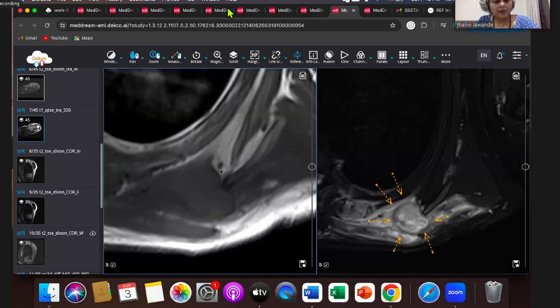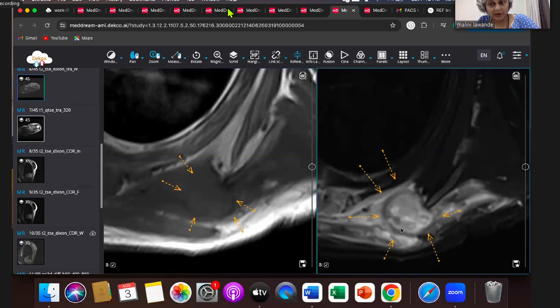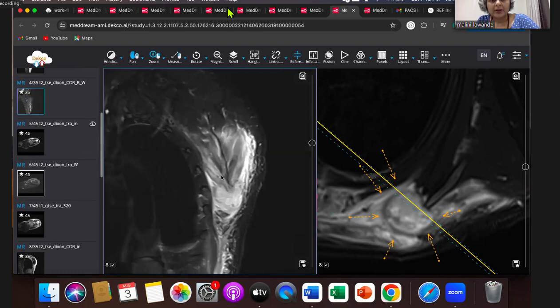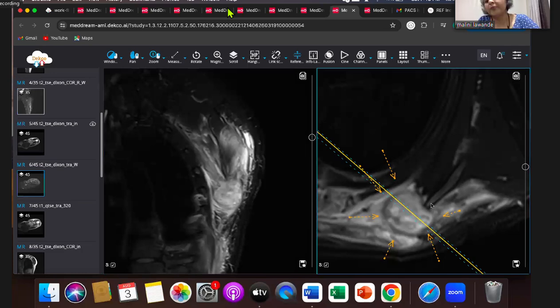Okay. Now, on this image, if you will appreciate, the rim is not hyper. Can you see a hypo rim? And the center is not very dark. The periphery is hyper. On T2, you can see the periphery better, but whatever you are seeing there on T1 is hypo. You agree? And the edema is very, very disproportionate. I'm giving you a clue. It is none of the diagnoses which have been said before. Osteochondroma, I'd see continuation with the marrow. I'm not seeing any continuation with the marrow.